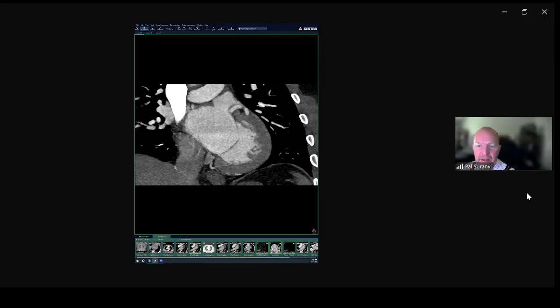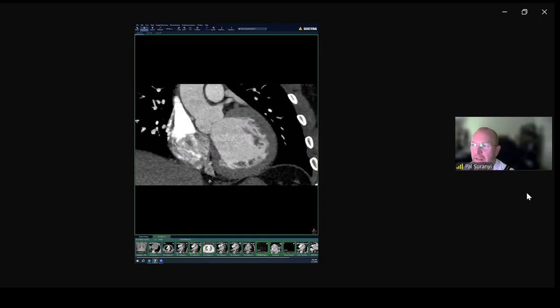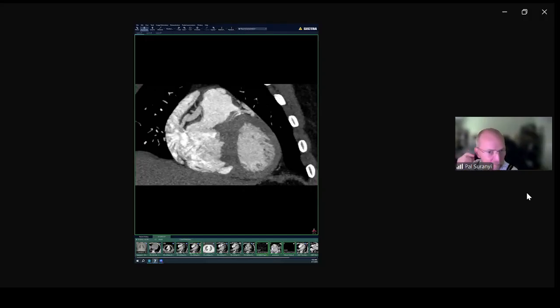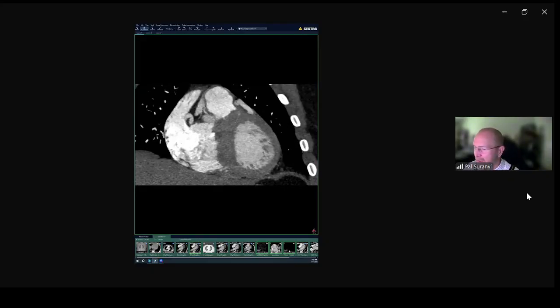I think in this patient we were unaware that this was going to be the finding. So I think we probably primarily aimed, let's see, actually, no, I'm looking at the exact history. It looks like this patient came through maybe the emergency room with chest pain, and I wonder if we scanned the whole chest.